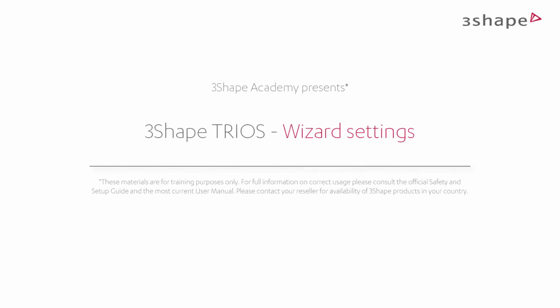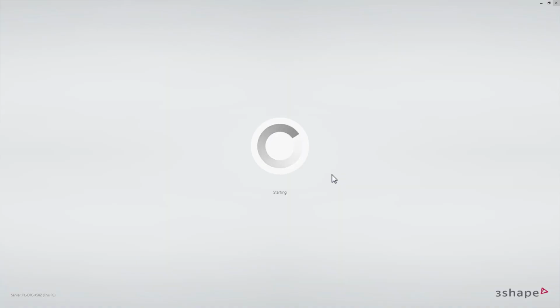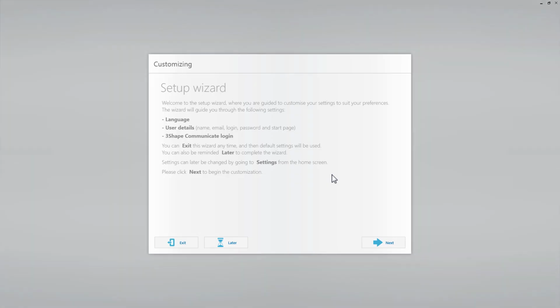In this video you will learn how to navigate through the wizard settings. When you log in for the very first time, or the first time as a new user, the Trios application will give you a setup wizard on the screen. The wizard will guide you through the following settings: language, user details, and 3Shape Communicate login.